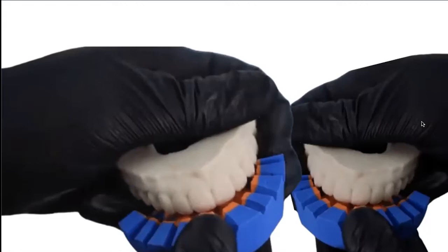I would say about 25 minutes to do two of these mock-ups, which allows you to take more control of your treatment and also take the freedom to design and change and try on different smiles to better collaborate with the dental technician if you are going to work with them still, or work better on your cases, doing everything in your office if you also have a 3D printer and a milling machine for later.